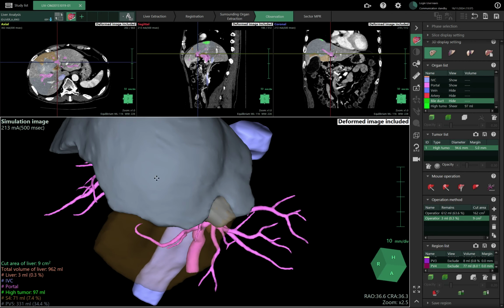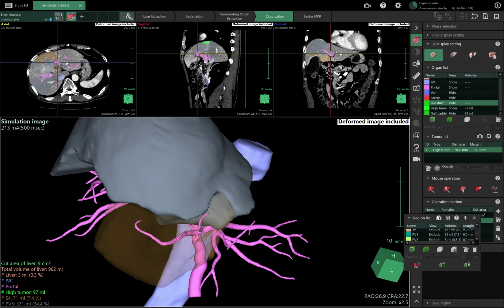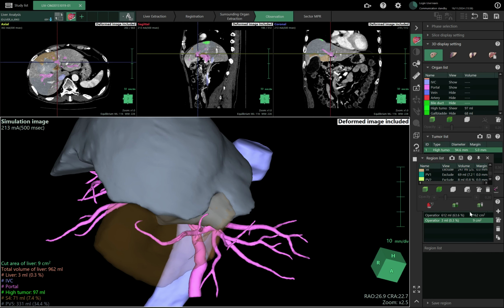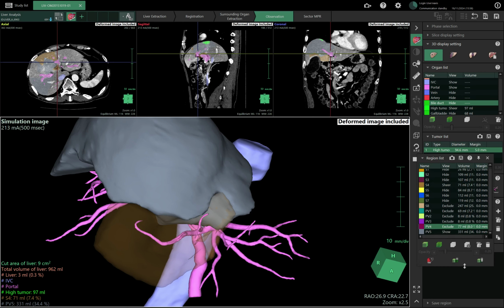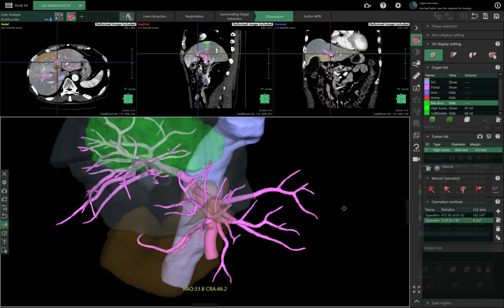So this is really the liver volume and everything that is going to be extracted from that point of the vessel. And you have so many of them here, this is too small. And there's no clicking here to get it out. I will drag and drop. But I cannot. Now, instead of this, I will show this in transparent or whatever.